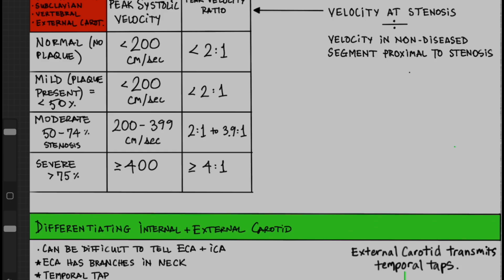This is just how I do it. It helps to have some way to judge how bad a blockage is. Some doctors will just say there is plaque present and won't try to qualify it. So this is a touch controversial, but anyway, this is how I do it.